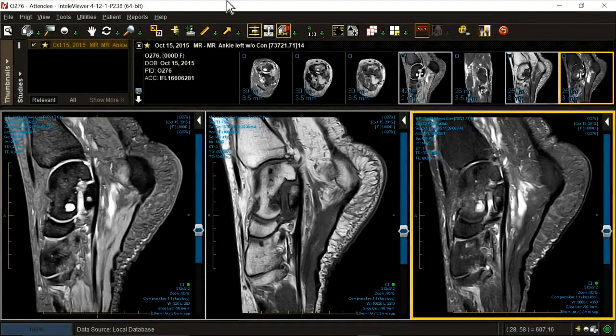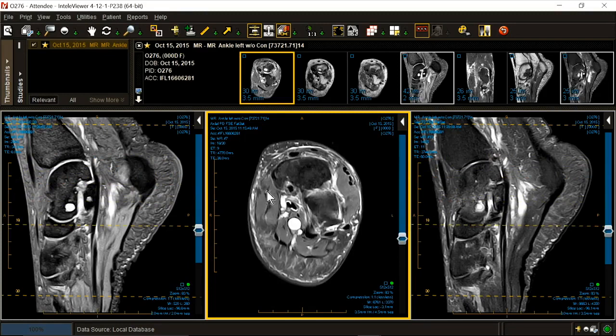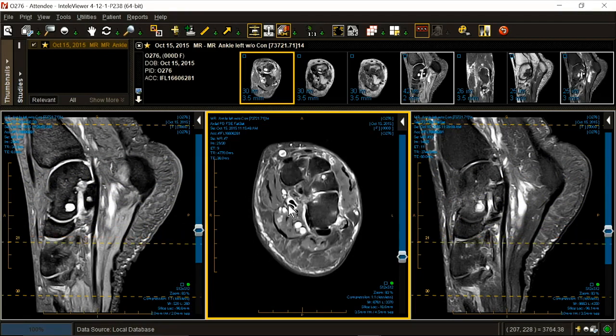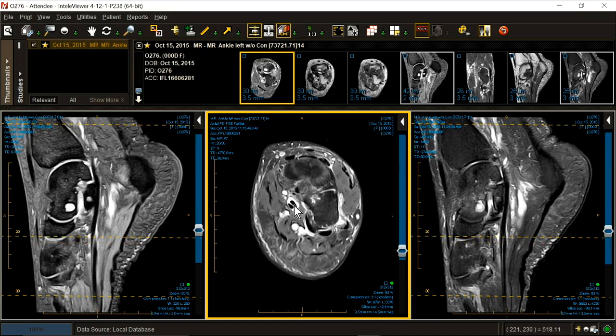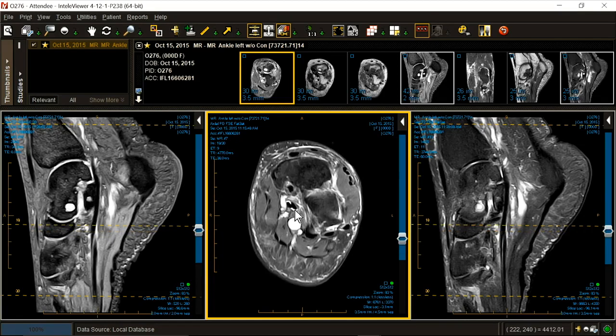longus. The flexor hallucis longus may crisscross with the flexor digitorum down low. Here they are crisscrossing, and the fluid just sits there around these two structures. This is called Henry's master knot recess. When there's a lot of fluid there, surgeons are tempted to remove the cystic mass. Don't let them do it.